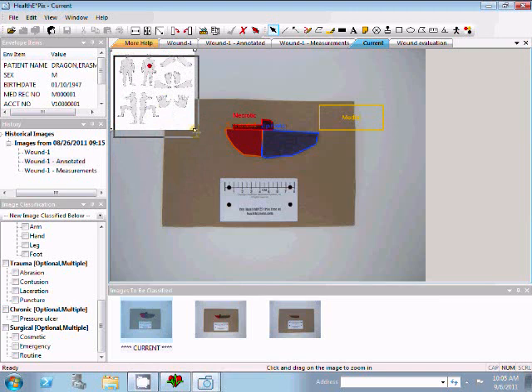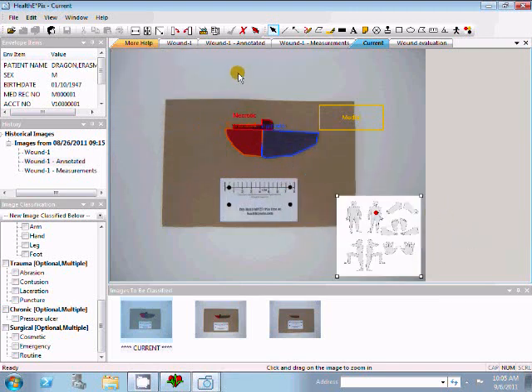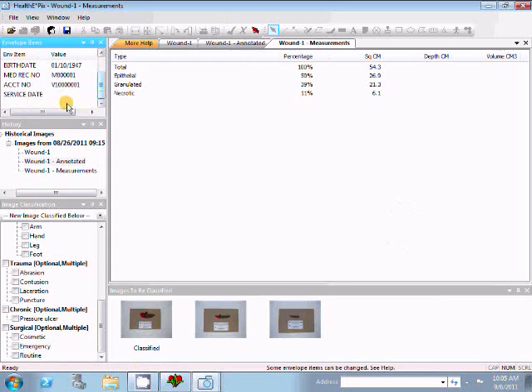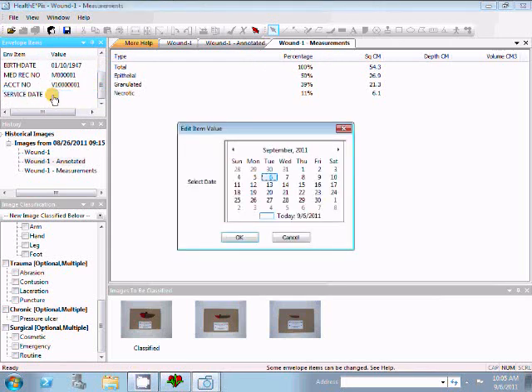In either case, the small image of the wound locator appears on the current image, and I can resize it and move it around. This becomes an annotation, just like stamps, measurements, etc. After I classify an image, I can do another one for this same patient. It might be another picture of the same wound, or it might be a new picture of a separate wound. There's no limit to the number of pictures I can process for a patient.